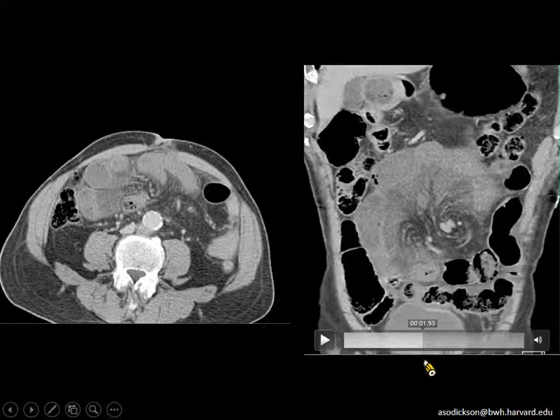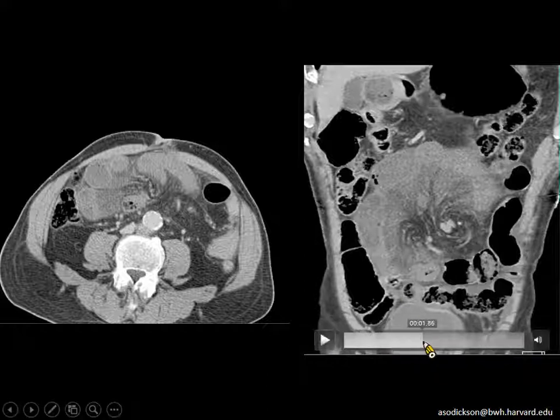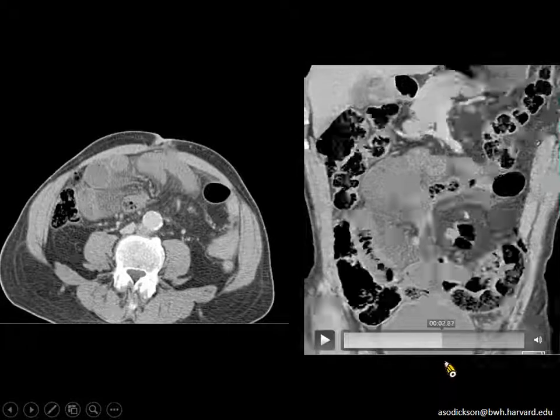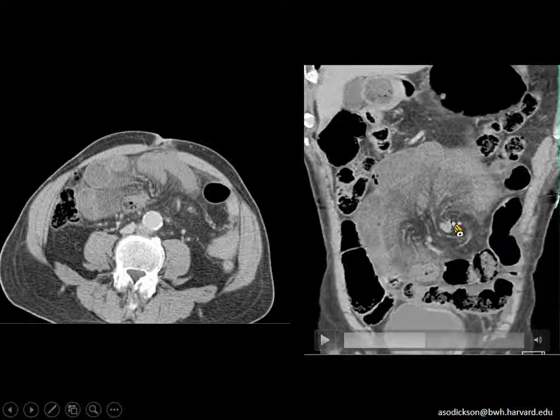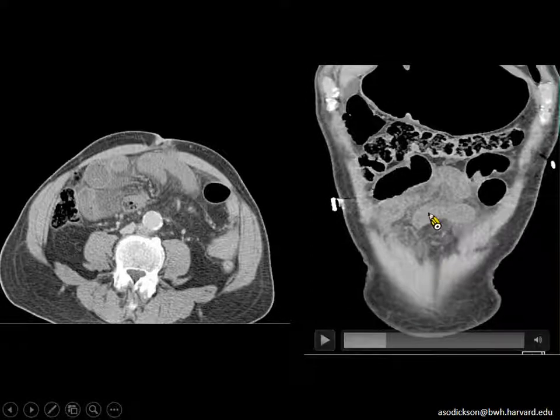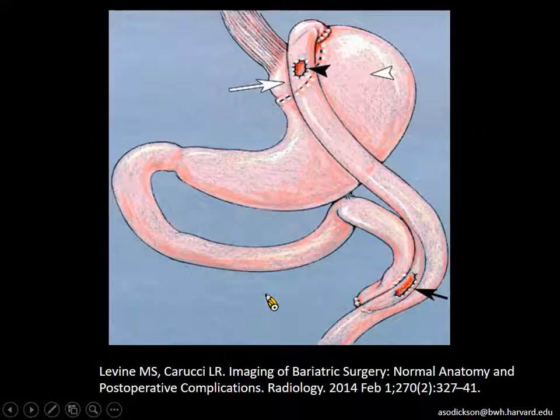And this is the so-called mesenteric whirl or swirl. As the mesentery is being distorted, usually by an internal hernia or a volvulus around an adhesion, this is another very helpful finding. Our job next is to look at our transition points. Here are two bits of decompressed small bowel leading into this area where we have our distended loops. So this is another closed loop bowel obstruction, just with another finding that we didn't talk about, this mesenteric swirl or whirl sign.